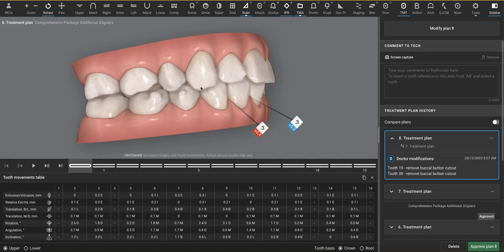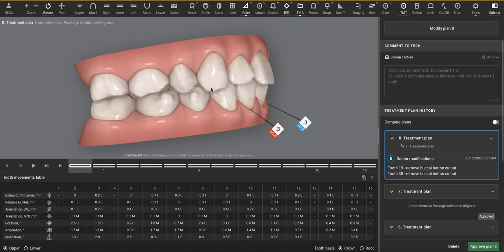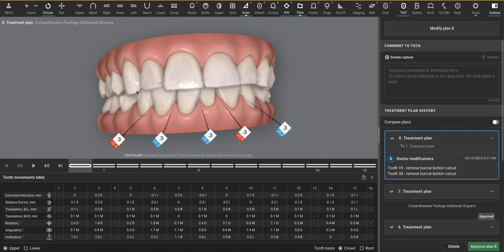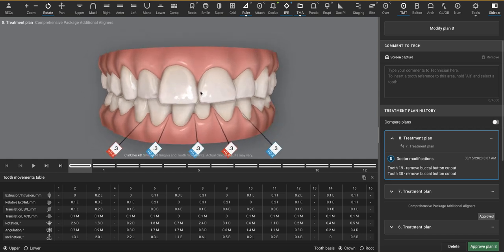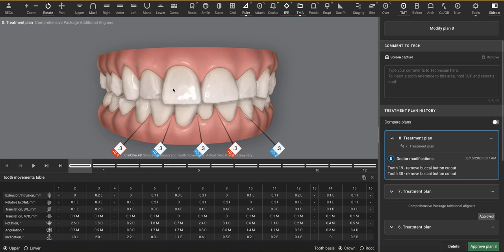So here's what I would say. The patient doesn't want to do any class 2 corrections or any sagittal corrections. She has very wide teeth on the upper anterior, which means we can't unravel her potential Bolton discrepancy through expansion of the upper arch because her teeth already look too wide. So really, our only option here is to do IPR on the lower.